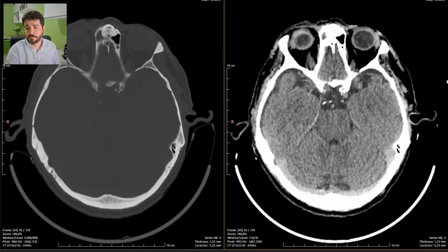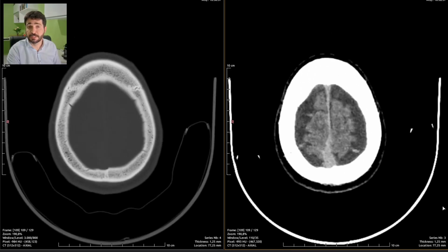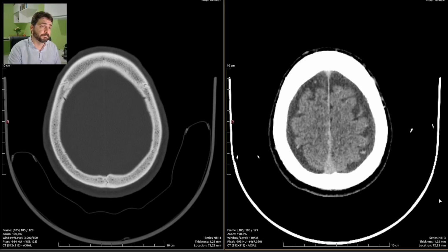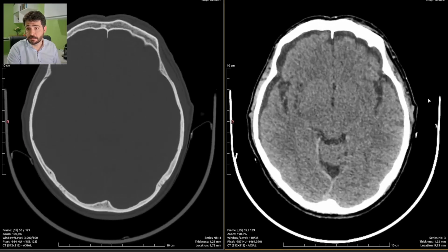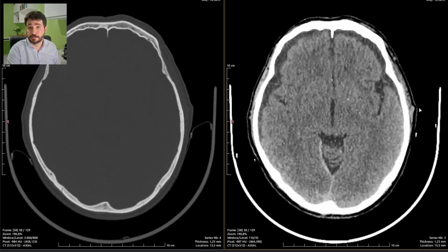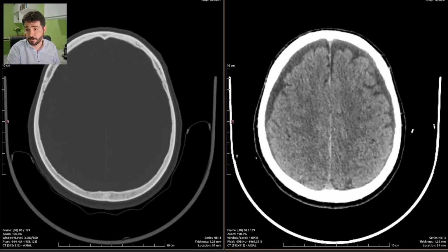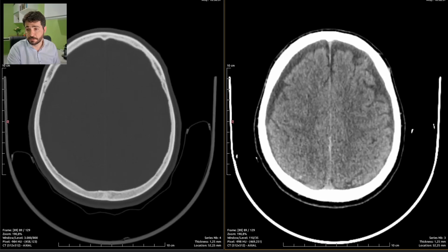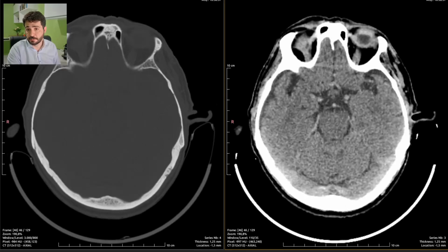Chronic subdural hematomas can be the cause of a bunch of weird, awkward, odd presentations of brain diseases, and in some cases when the neurosurgeon sees that it's necessary, they can even go through a surgery for drainage.